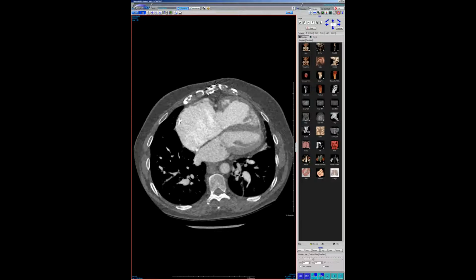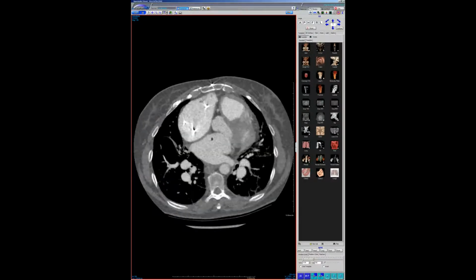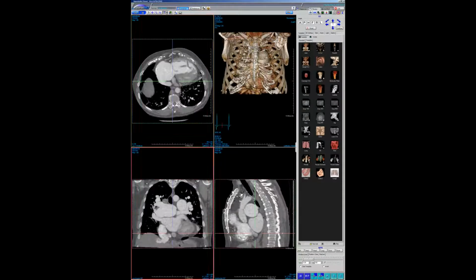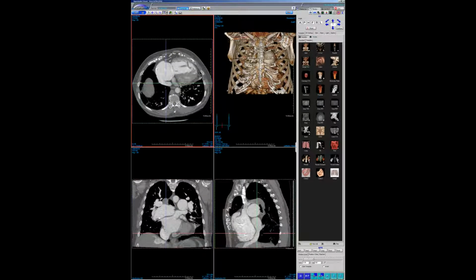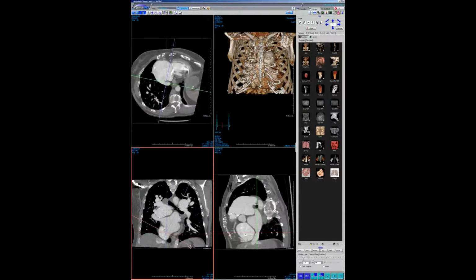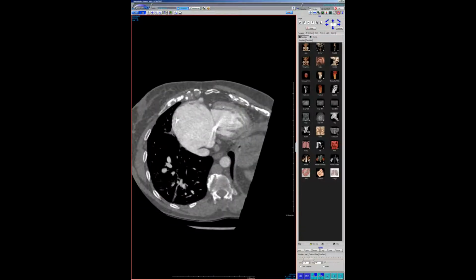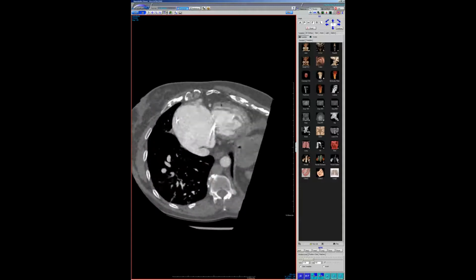And no real comments were made on the pulmonary hypertension or the big PAs at the bases and some scarring. She was being treated as PAH. Technically, this is now considered type 1 disease. It's been changed, but truly idiopathic PAH. And then she was worked up for CTEPH, which of course was negative. That was the reason for this CT, was for CTEPH.